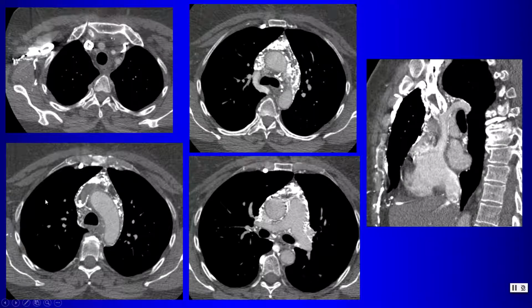So what is going on here? So here are these collateral vessels full of undiluted contrast that are opacifying around the mediastinum, so we can see those clearly. Here is the catheter with the thrombus at the end of it producing the SVC obstruction. But just below the catheter and the obstruction, here is the superior vena cava right above the right atrium. So how did that remain patent?